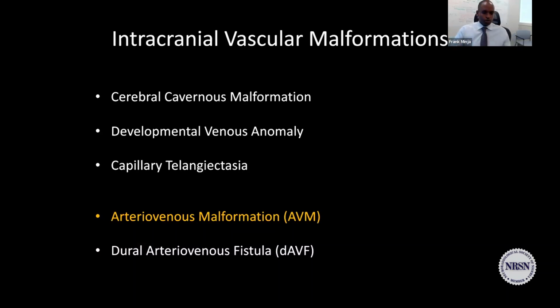So we have basically covered the universe of non-shunting intracranial vascular malformations. Okay, and hopefully I've convinced you that a cerebral cavernous malformation looks very different from a developmental venous anomaly. It looks very different from a capillary telangiectasia. So the point of this talk is, if you can get to, I am looking at a vascular malformation, and after that, you just have to drop it in one of these 5 buckets, you've done your work, right? As a neuroradiologist, you've really, really done your work.